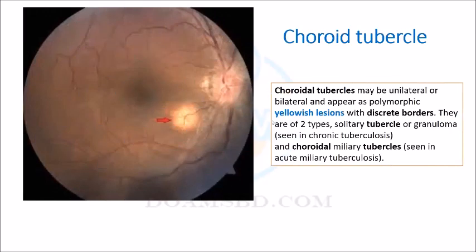And this retina, what is it telling? This is a reddish spot, but containing a big whiteness. Focal area, other part almost normal. What could it be? Don't worry, we are actually at the end of the discussion. Two minutes remaining. This is one example of choroid tubercle.